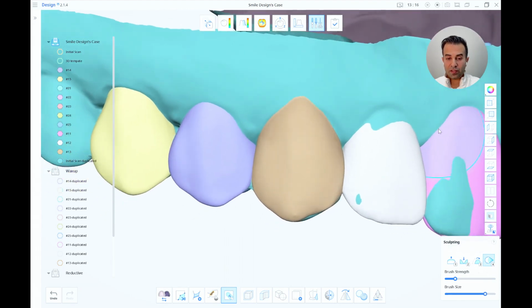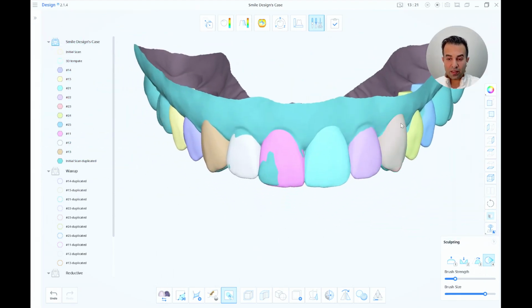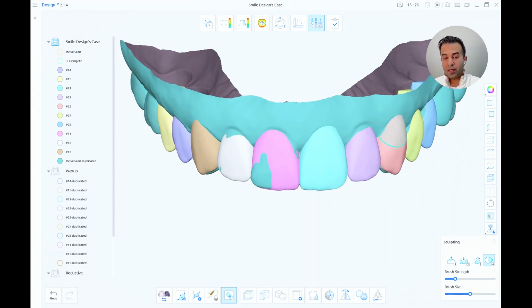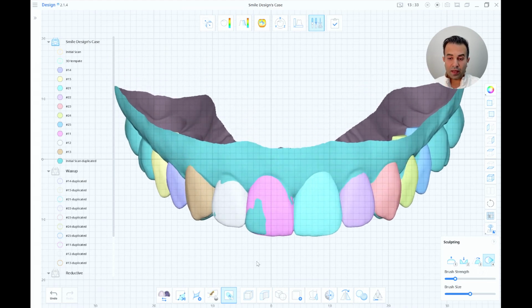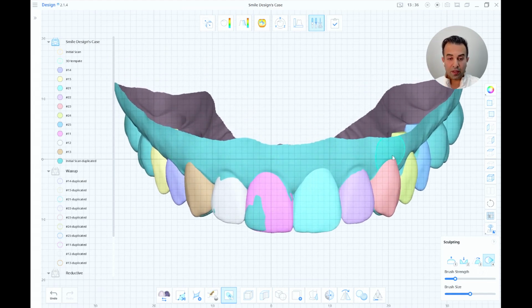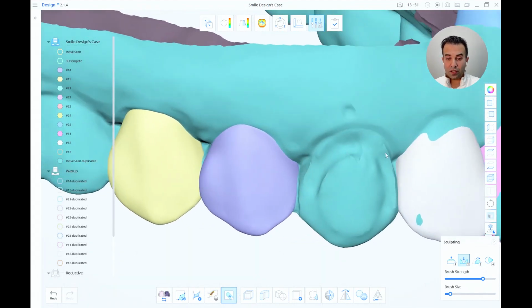You can view from the facial, and we can check symmetry with the contralateral canine. The gum, in this particular case, the gum height of the upper left canine is more favorable, so we will need to perform a gingivectomy in this particular case. So what I can do is place a dot using the horizontal line as a reference, and then you can do a digital gingivectomy.